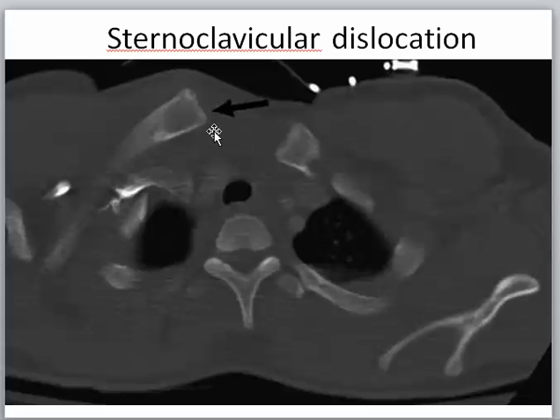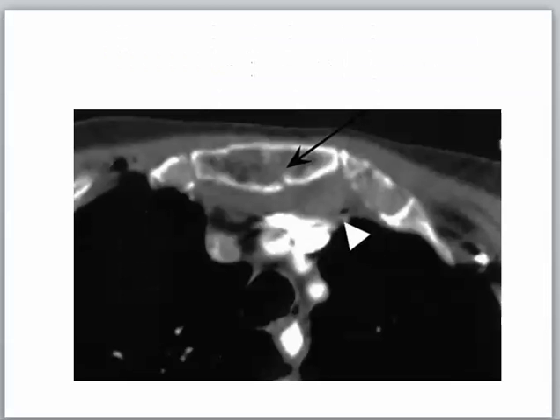Here we get this sternoclavicular dislocation. So in trauma, check the bony outline of the part examined, as this chest. There is a sternoclavicular dislocation. Here there is fracture of the sternum and some hematoma behind, a collection of blood.